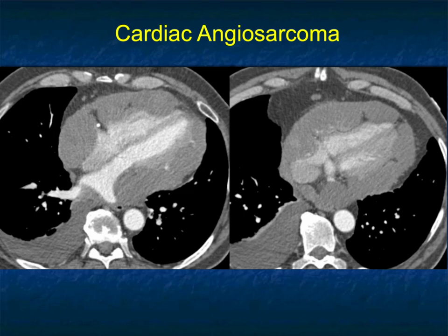I mentioned before that angiosarcomas can be infiltrating of the pericardium in the heart. Look how this one extends 360 basically. Look at the lobulations against the chambers. There's direct extension into all the chambers, all of these lobulations. Again, you could be thinking about a pericardial process. It's not simply pericardial effusion because it's too dense and has mass effect.